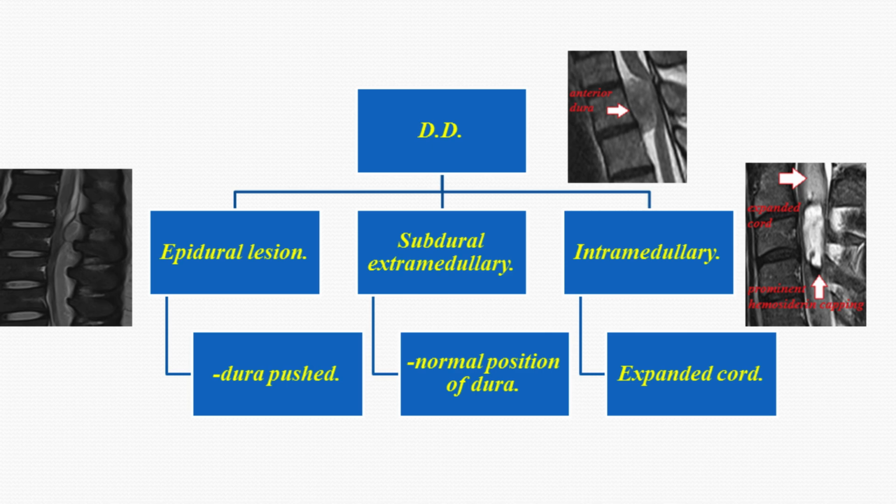In case of epidural lesions, the dura will be pushed from its normal site, while in case of subdural extramedullary, it shows normal position of the dura, and in case of intramedullary lesions, there is expanded cord.